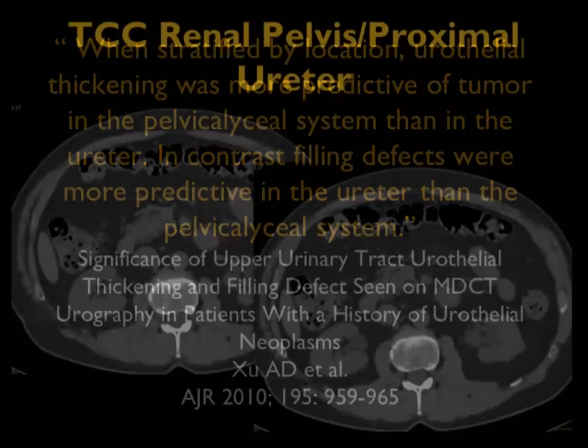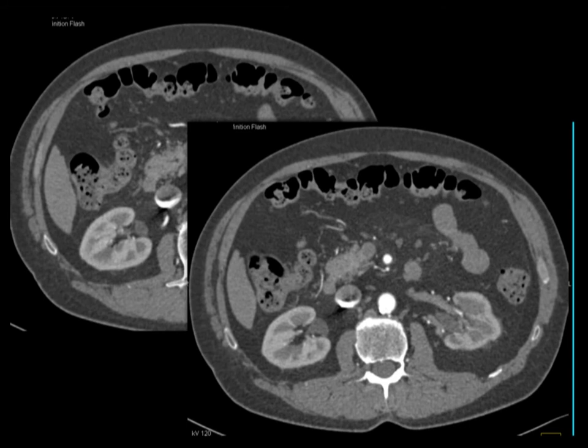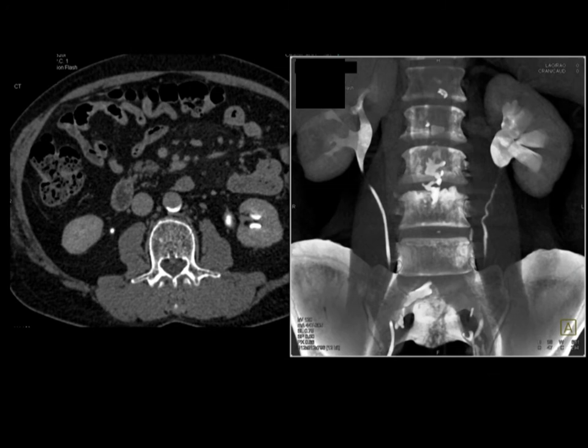Another example. Here we see evidence of a prominent renal pelvis. As we scan downward, we ask, what's going on in the patient's renal pelvis? Well, you look at the left kidney and the right kidney, and in the left kidney the pelvis is a bit dilated, but also the enhancement is not as good as the right kidney. It's decreased enhancement. Also, there's some irregularity of the borders of the left kidney, and you're worrying, could it be obstruction, could it be a tumor, could it be a stone, could it be pyelonephritis? You know there's pathology, but you're not certain why.